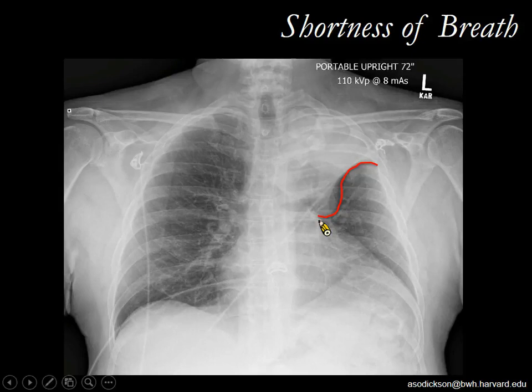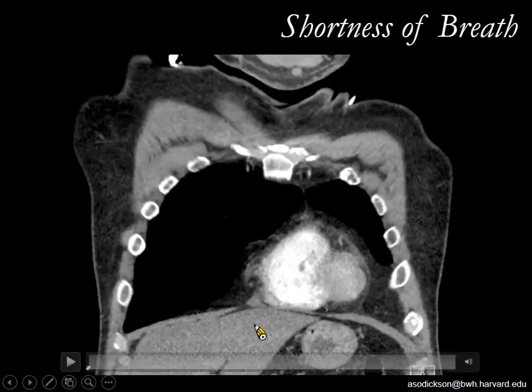I think maybe what some of you were thinking about was wedge-shaped consolidation from pulmonary infarct, perhaps. The other thing is PE can cause atelectasis, but not normally lobar collapse like this. But anyways, we have this X-ray. We're suspicious of a lung cancer and left upper lobe collapse. So what do we do next? We put them on the truth machine, which is our CT scanner.